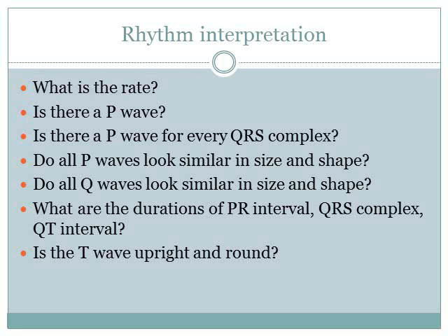And then we look at the P wave. If you use this method, it is very easy to understand and interpret ECG. So always have a way of reading the ECG strip. This is my way. You start with the P wave, and check if there is a P wave for every QRS complex.